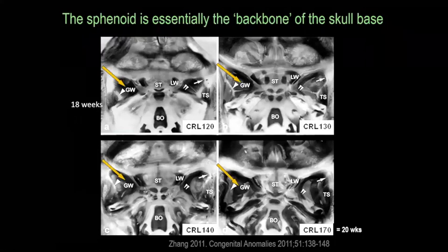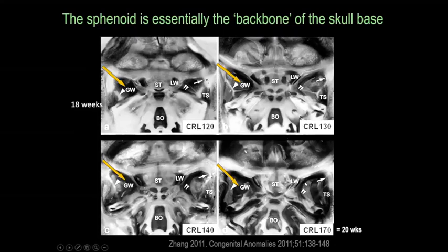The sphenoid is essentially the backbone of the skull base, and we can see here at 18 weeks gestation and at 20 weeks the greater wing of sphenoid and the lesser wing of sphenoid.